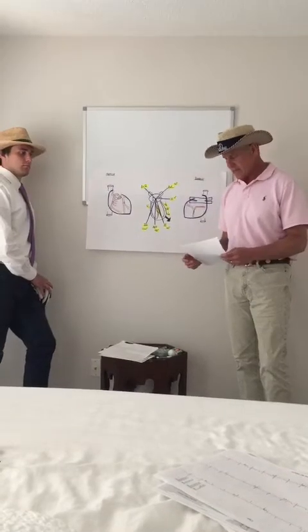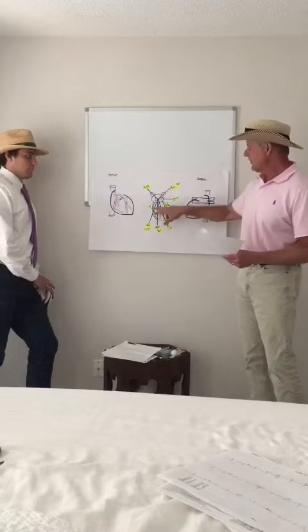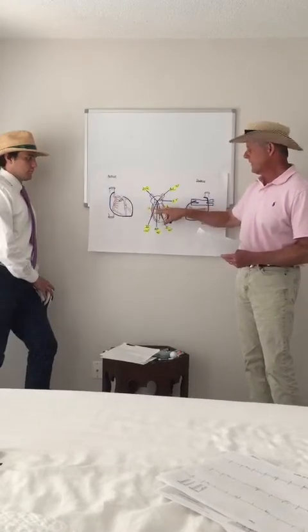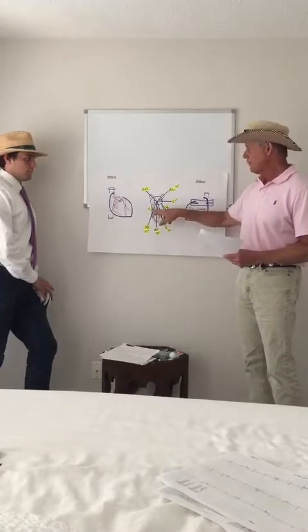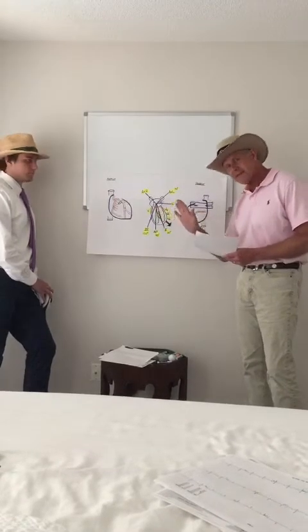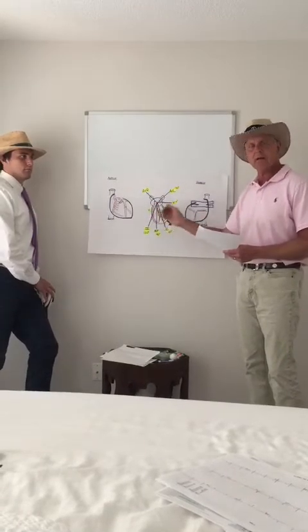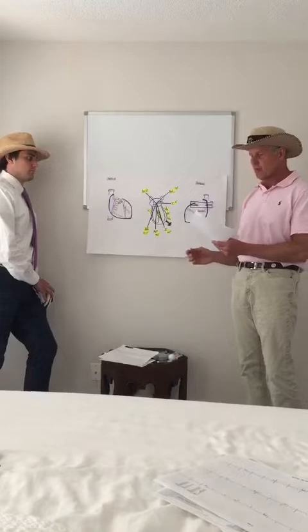So I have an EKG here. Everything's reversed in the posterior wall, and you've got to look in leads V1 and V2 for the posterior wall. You remember V1 is looking over the right side of the heart, the right ventricle, but it's also creeping around the corner and looking at the posterior wall. But it brings its friend V2 with it.